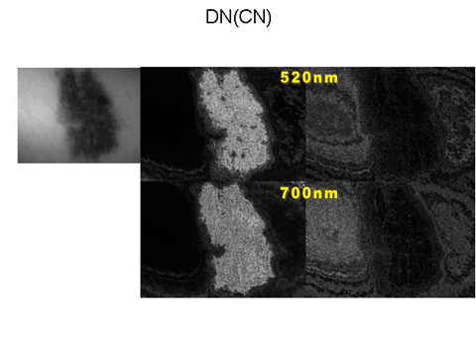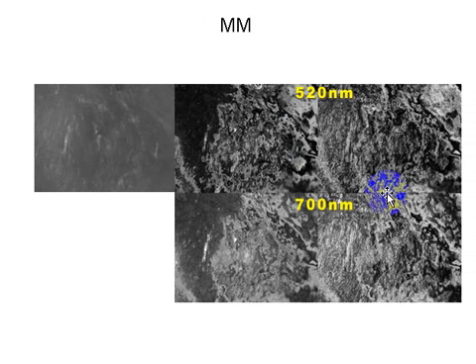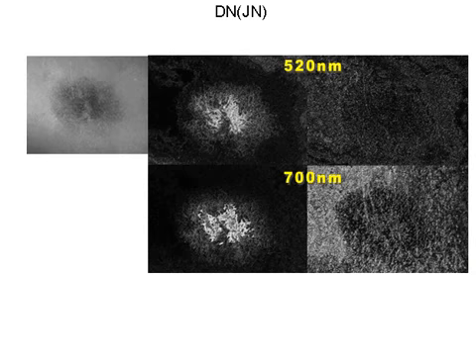It is dysplastic nevus with tendency to a compound nevus. Another one, another dysplastic nevus. There is no correlation, compared to malignant melanoma where you can see a very prominent correlation between them. Another dysplastic nevus with tendency to junction nevus.